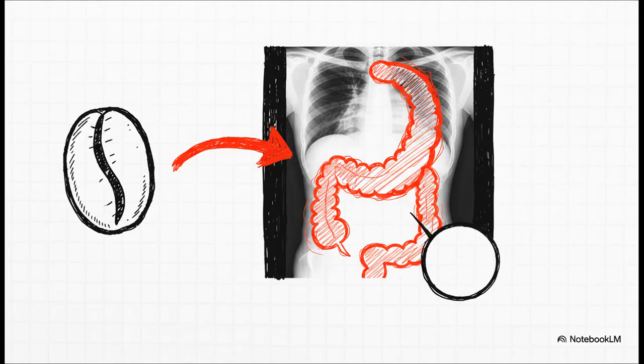Next, B for bowel, and bam! There it is. This is where it all becomes crystal clear. We have one single enormous loop of bowel that's just dominating the entire image. And what does it look like? It's our coffee bean. It's unmistakable. And notice how it's so stretched out that all those normal haustral folds are completely gone, just smoothed away.